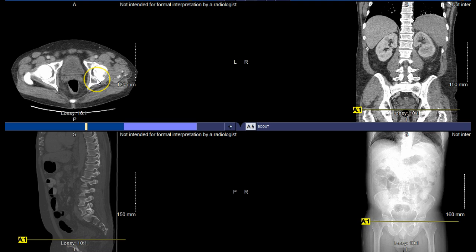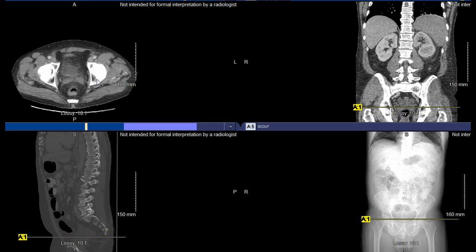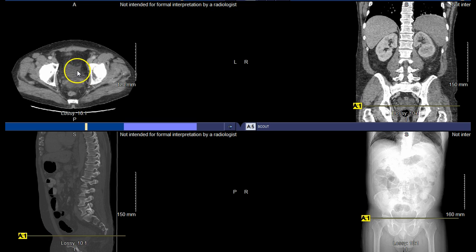In terms of true male anatomy, the important structures are going to be to understand the prostate gland and the seminal vesicles. You can get a sense of where we're at, utilize these tools to your advantage to say, all right, I get it, I know where I'm at. So we know what we covered before. You'll be able to see the bladder, the formation of the bladder. You can see the rectum back here on the posterior aspect. As we continue to go down, there's that bow tie right in there. So basically the formation of the seminal vesicles, with the vas deferens in the center aspect of that. Seminal vesicles, bladder is anterior to that, rectum would be posterior.